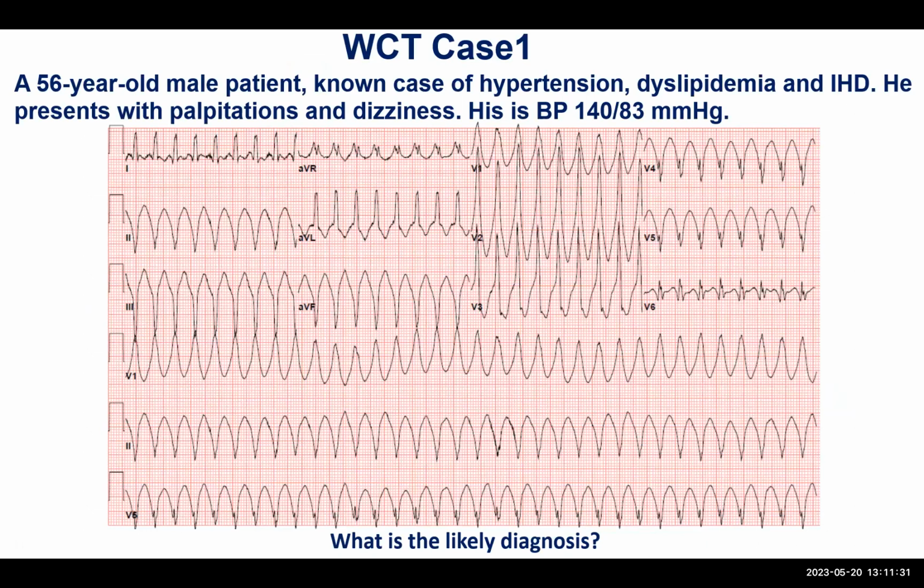I see a VTAC there, okay. VTAC, okay. Can somebody explain why you think it is a ventricular tachycardia? Why you made that diagnosis quickly? Okay, I have heard that one, wide QRS complex tachycardia. Excellent. If you look at the history itself, ischemic heart disease is suggestive, of course, from the beginning, but we will go to other criteria. We will discuss it in a minute.